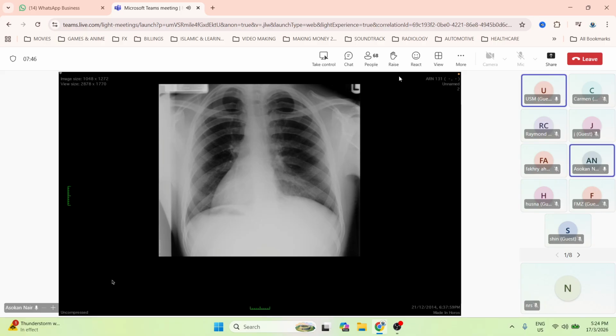Okay, you are reporting your normal radiographs every day. You're sitting in your room, and this pile of X-rays comes, and this is one of them. What is the first thing you would do? First thing, looking at the marker. Yes, okay.